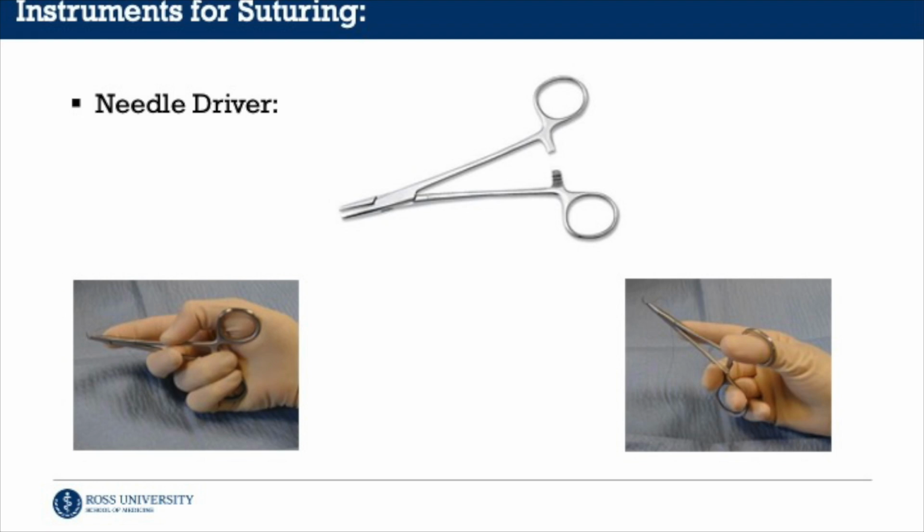And then, of course, there's the classic thumb, ring, finger technique. The thumb in one ring and the fourth digit in the other ring with the index finger pointed. And there are no techniques where the second digit is in the second ring of the needle driver. The image on the left is a representation of what the palming technique for holding the needle driver would look like, and the image on the right is an example of the classic thumb ring finger technique.